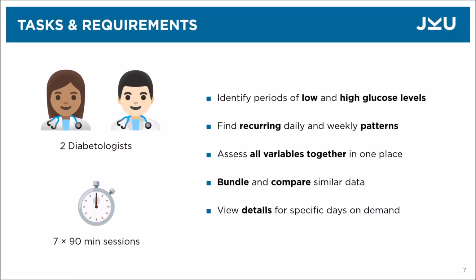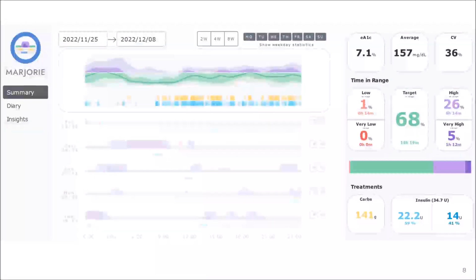We designed a combination of visual and algorithmic approaches to fulfill these requirements. In an iterative design process, we refined our designs based on feedback by the diabetologists. Our final solution is structured into 3 views.